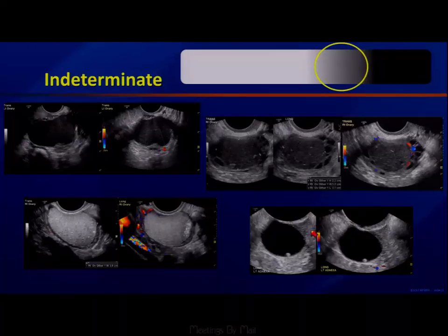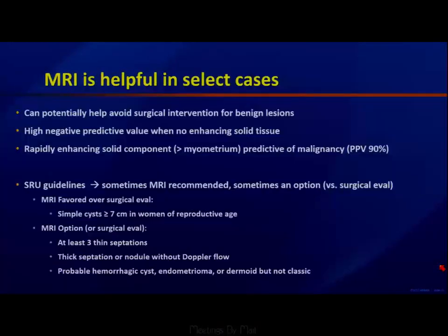And then we had this lesion, which mostly looks simple and has a hyperechoic sort of focus at the periphery that really looks benign to us, but not definitely a wall calcification. So these are considered indeterminate.